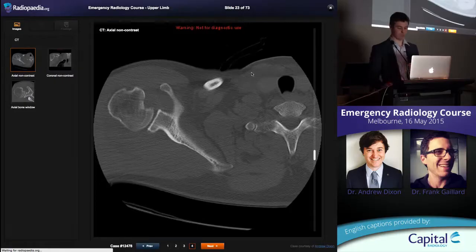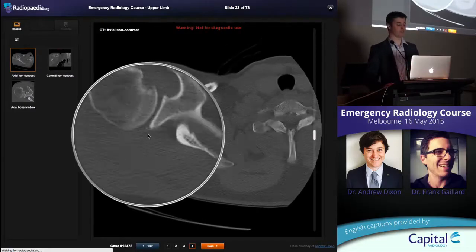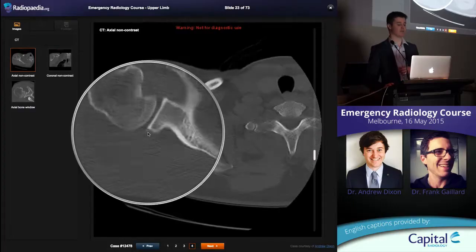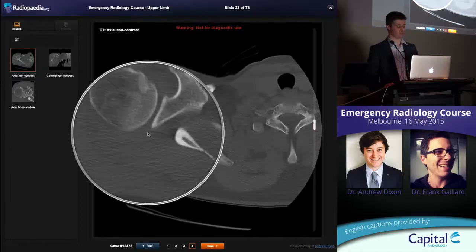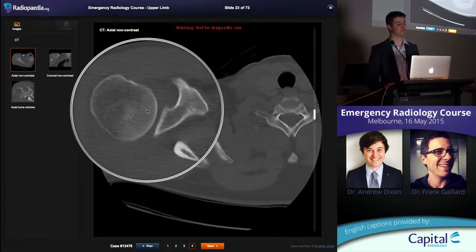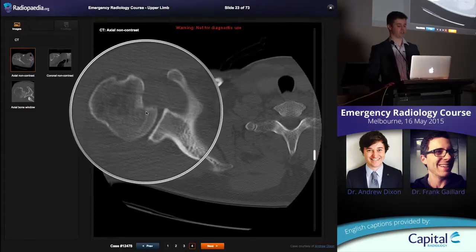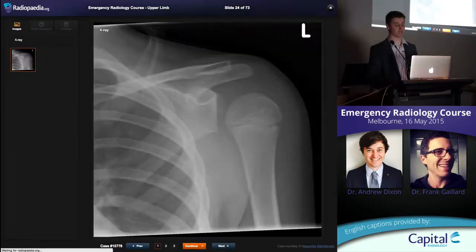We look at the CT in this patient. You can see here the equivalent to what we saw with the anterior dislocation happens at the back of the glenoid. You get a small avulsion fracture, so that's called a reverse Bankart lesion. And that impaction, that trough line sign that we saw on the plain film, or a reverse Hill-Sachs lesion at the front there. So exactly what you'd expect to see from direct impaction bone on bone from the dislocation.